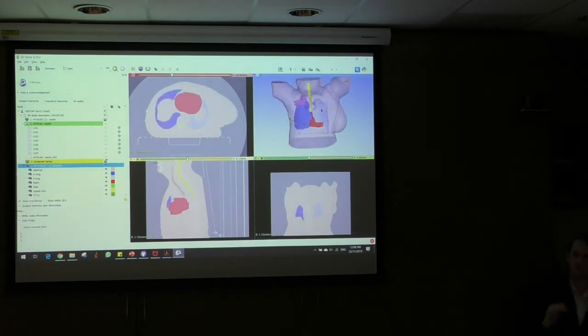That right there is your 3D file. That's your 3D mesh, essentially. What you saw before with the volume rendering is the volume rendering of just the CT scans. There is no mesh information in that at all. So you need to contour, create your segmentation label map, and then you can export that as your 3D structure. Okay, so with volume rendering, we can't export as an STL file. With volume rendering, no, not to my knowledge.